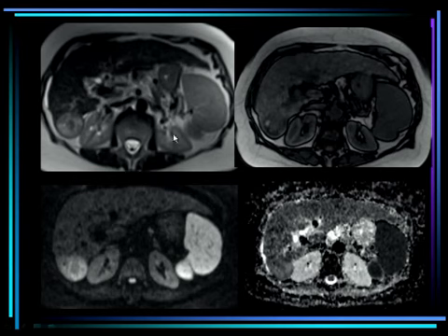Using diffusion weighted image, now we'll go to another case where you see on the right lobe of the liver a lesion. In fact, you see a second nodule within, and we're going to talk about that, nodule within a nodule. You see that the lesion contains some fat, and on the diffusion weighted image, by high b value, you have a high signal intensity. On an ADC image, you have low signal intensity. Those are characteristics for a malignant lesion.